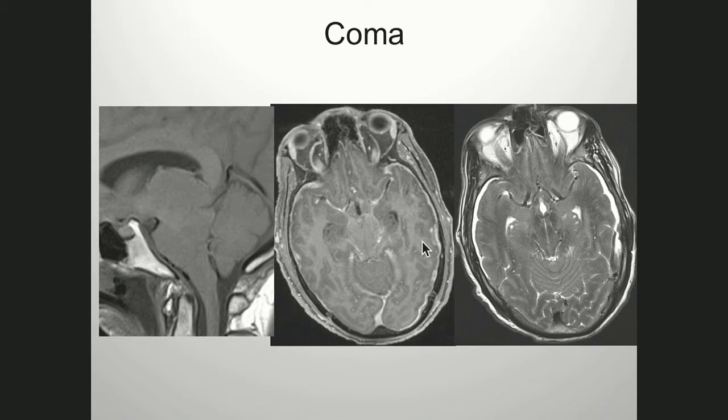So this contrast is given, and you see the bilateral dural enhancement, and in addition, mild subdural collections.